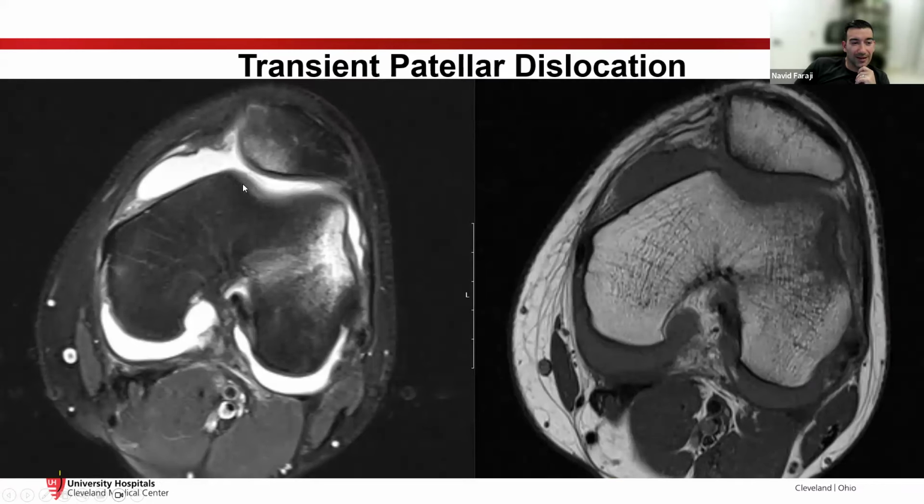Okay, here is that, and then axial plane, lateral is a little bit longer than medial. Here's your contusion. We want to look at the medial patellofemoral retinaculum. Again, it's black. It shouldn't be disrupted by fluid, shouldn't be too thick. And so maybe it's a little gray here. Maybe there's a mild sprain, but nothing crazy.